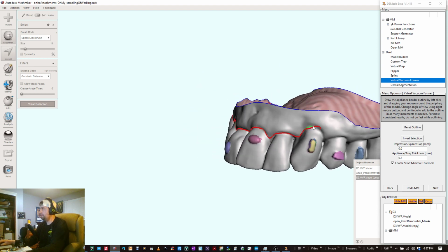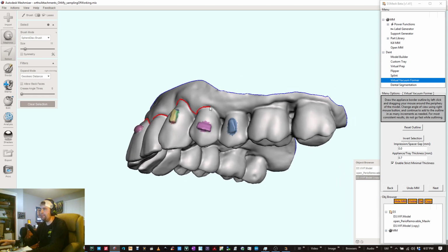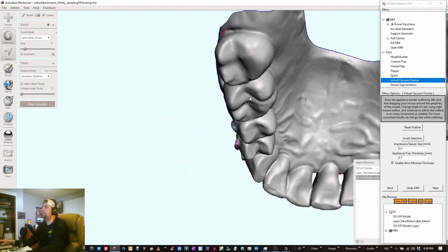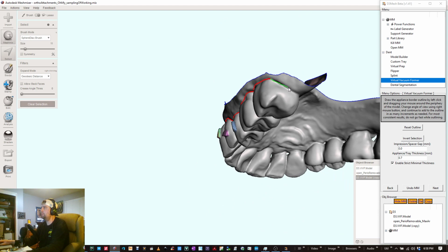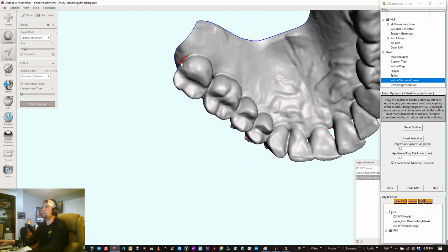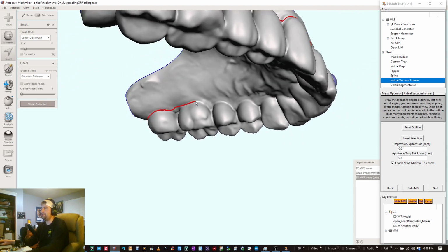Oops. Definitely not getting that far in, or approximately here. So if I bring this margin in a little too far, you'll get intersecting surfaces when you go through the next steps. You can even see the line right there on the other side. Try to avoid that.